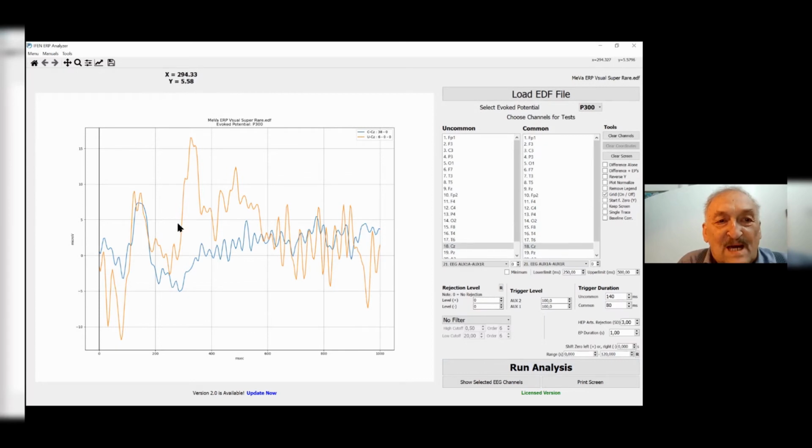This is the red line. There were 6 triggers, and for the common event, the X, there were 38 triggers.